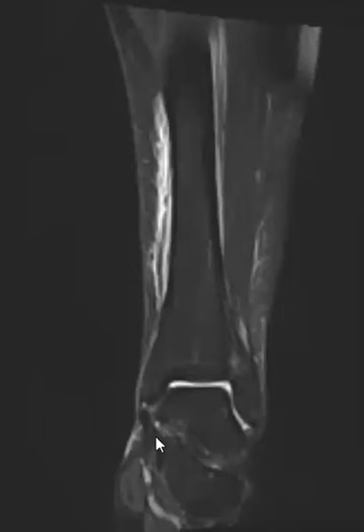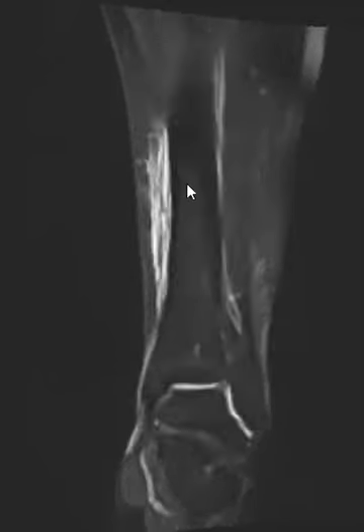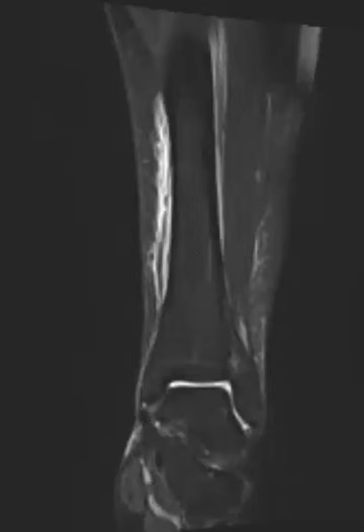And at the most severe end of the spectrum, we get horizontal fracture lines that are dark, black, and lots of surrounding marrow edema. A lot of times you'll see edema within the cortex as well. And when you see a linear macroscopic transverse fracture line, then we'll say there's a tibial stress fracture.